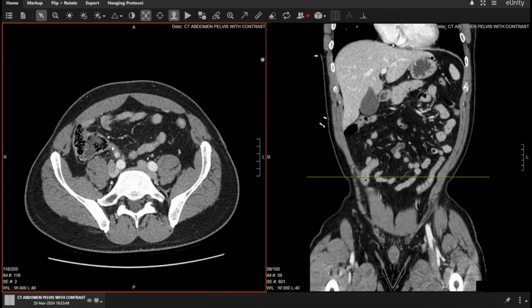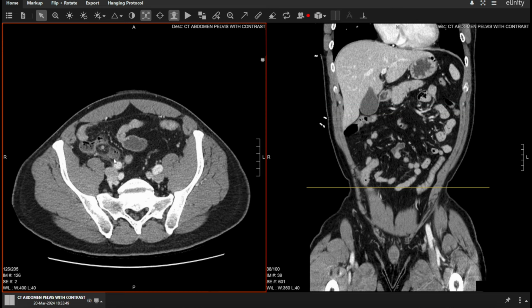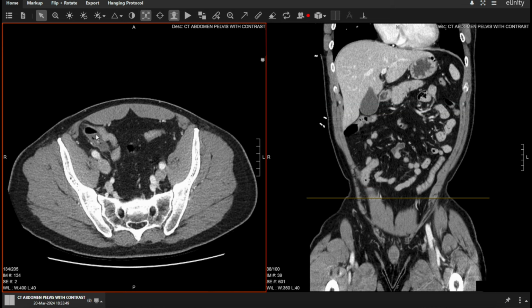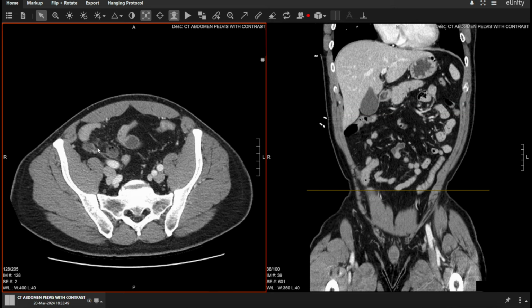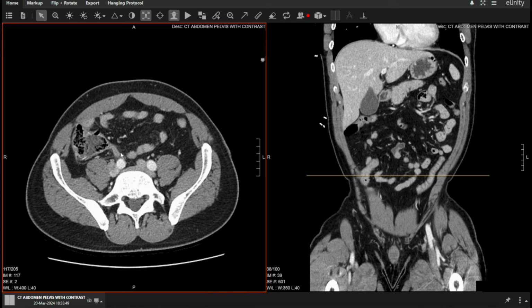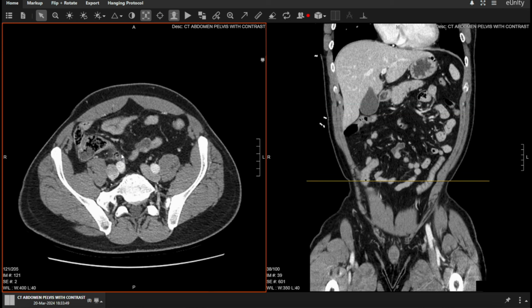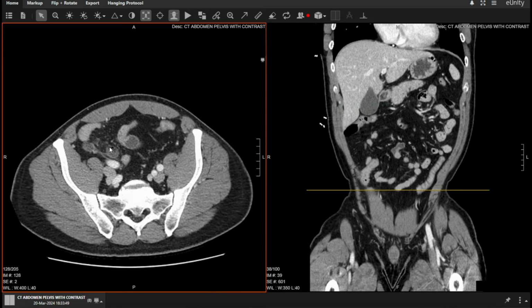And so this here is the appendiceal base. This bright thing is a fecalith, which is blocking the appendix. And this here is a dilated and angry, inflamed appendix all the way up to here. Now, one thing you'll notice, the inflammation, I showed you a previous image of an abscess with localized inflammation. You'll notice here that this fat is much more hazy in appearance, a little bit brighter in color. And that includes here in this area compared to perhaps here. That's all the inflammation from the appendix. There's no signs of perforation, though.